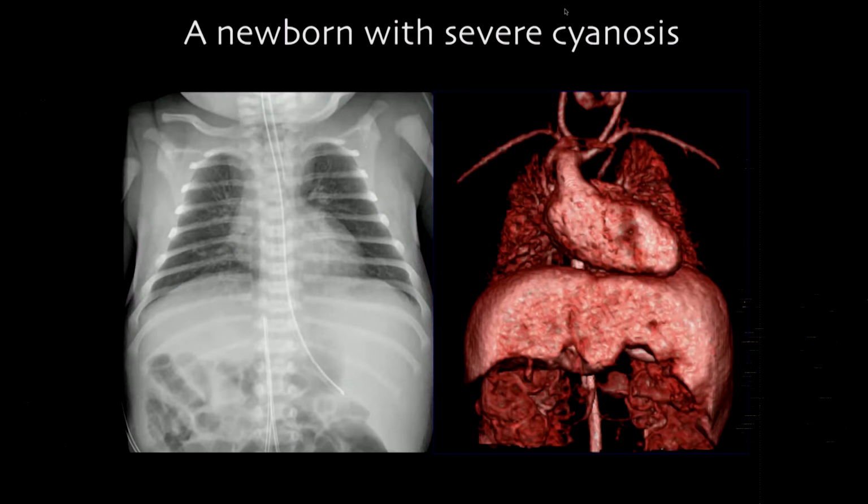In the chest film, you can see the stomach on the left side, however, in the lateral, you have some haziness here. And in this case, you have your catheter in the IVC and aorta on the same side, juxtaposition of the abdominal aorta and inferior vena cava, in a patient with some reticular pattern here. So that's why I always say, when you have a patient with a cardiac diagnosis, look at the abdomen first. You already have quite significant information.